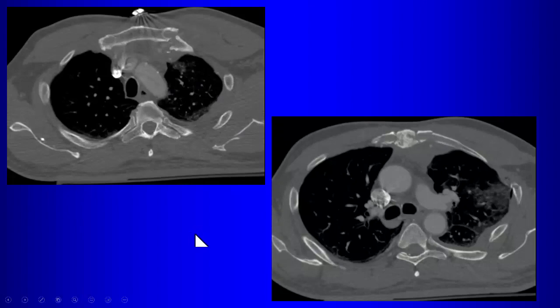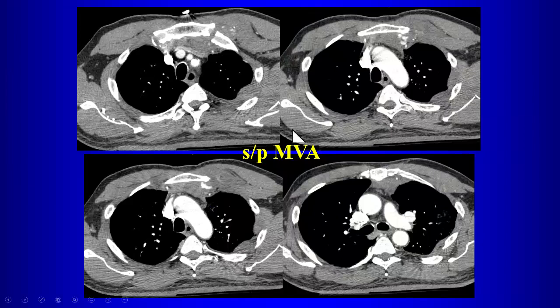So, wait, like behind the sternum on the upper right? Yeah. Could that be like active extravasation or something there? Yeah, they did. Well, these were vessels. This was not extravasation on this particular slice.